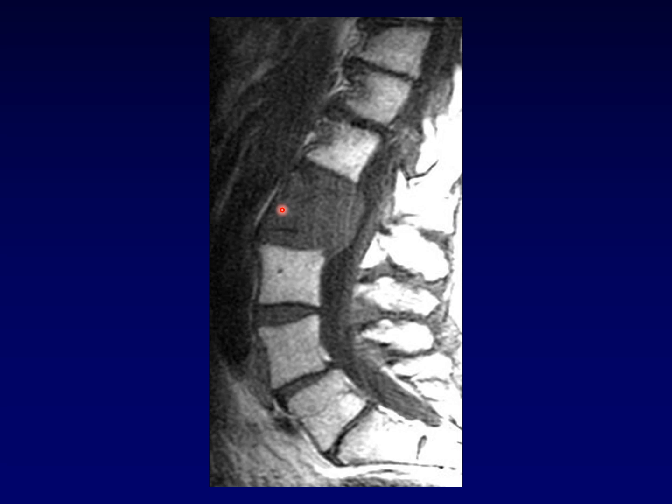Well, this vertebral body was entirely replaced. It's not filled with its normal marrow anymore. Instead, it's been replaced by tumor cells. This is metastatic disease in which the metastasis has completely replaced the vertebral body and expanded out into the central canal to narrow the central canal and crush the cauda equina. Metastatic disease.